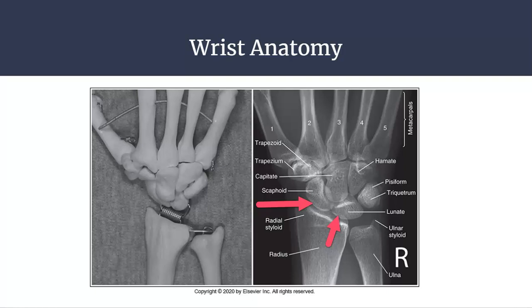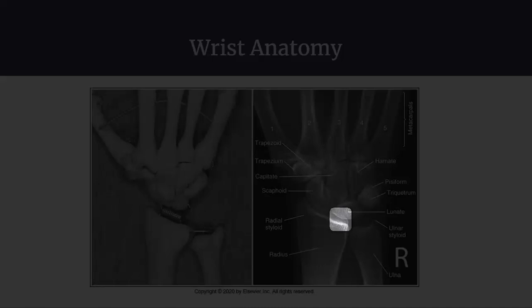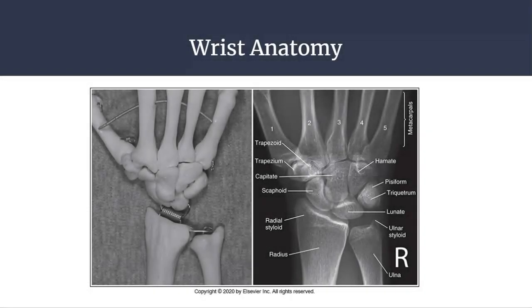The anterior and posterior margins of the distal radius are not superimposed. Posterior radial margin superimposes no more than 1/4 of the lunate. The 2nd through 5th carpo-metacarpal joint spaces are open. The long axis of the 3rd metacarpal and mid-forearm should be aligned. The lunate midpoint is positioned distal to the radio-ulnar articulation. The 1st metacarpal is seen without 2nd metacarpal superimposition.